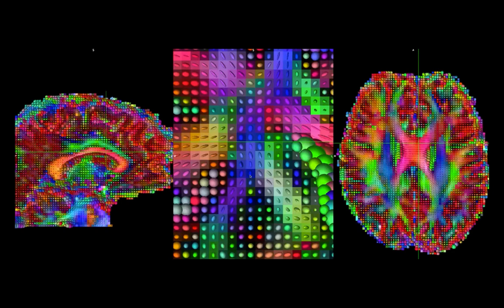Which is why I always recommend, as part of quality control, to check these maps, either the fitted tensors or, as we'll see in MRtrix, the fitted tracts, to make sure that the major tracts make sense. So with the corpus callosum, obviously it should be primarily red because the fibers are going mostly from left to right. If it's green or blue, then something might have got messed up. But that's one of them.